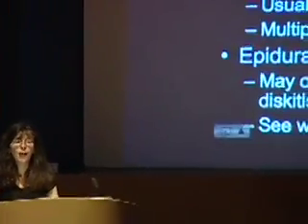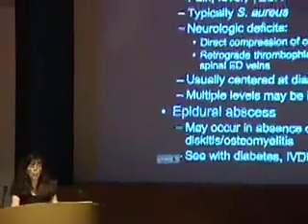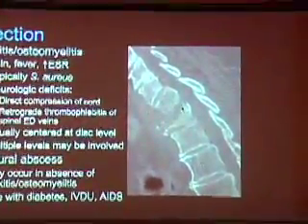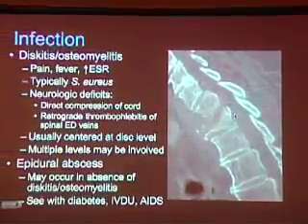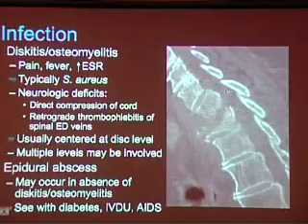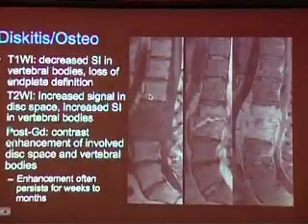And here's just a fairly typical but pretty far advanced sagittal CT scan looking at the cervical spinal column in a patient with discitis osteomyelitis, where you can see that the problem is centered at the disc level, the vertebral bodies are fragmented and collapsed, and you can imagine that this patient might be suffering or having myelopathic symptoms from lower cervical, upper thoracic cord compression.